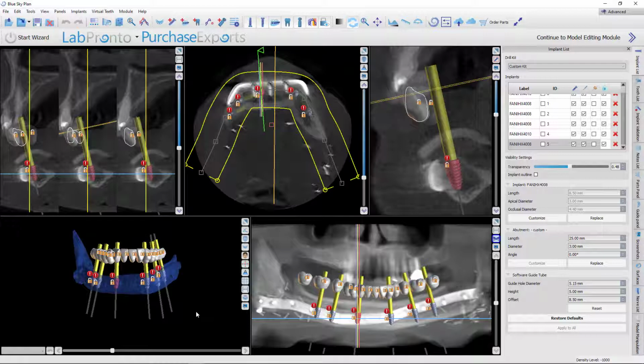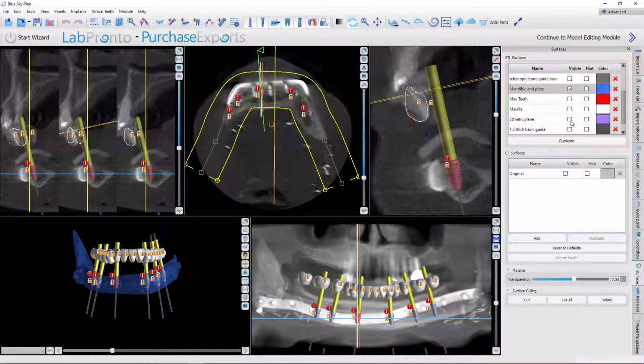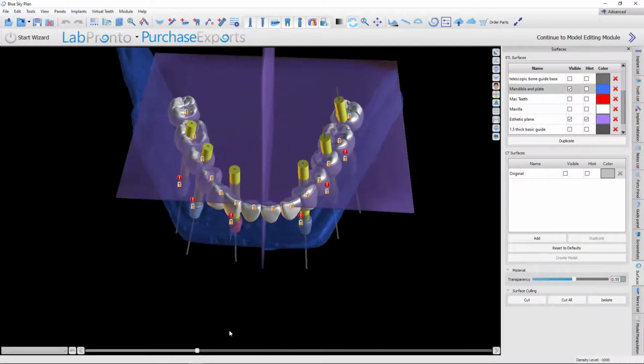And if I can do that, then setting them to the mandibular arch normally would be much easier. Here, we're not doing the maxillary arch. It's just so hard because this is a fibula, not a mandible, so all the anatomic landmarks are gone. So anyway, this aesthetic plane is a really valuable tool that you can use, and it's incredibly easy.